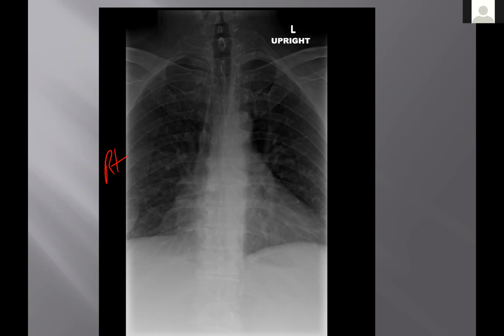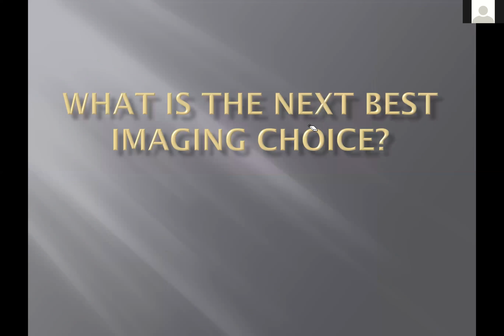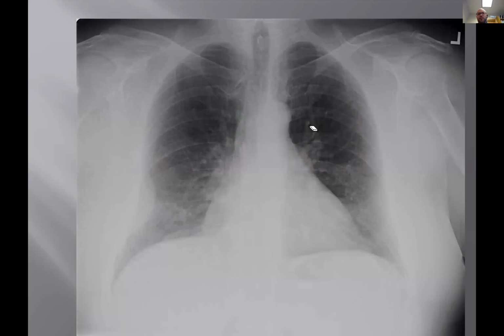Follow up that soft tissue mass? Yeah, right here. Just follow that up. So would you want to do the AP chest then? Yes. Yeah, do a PA chest. That's really good. 72-inch, collimated out, the right kVp, a real chest film. All right, so that's good. That's the next best. Okay, somebody needs to get muted here. We're having some background noise. The next best imaging choice is a chest film, and there it is.